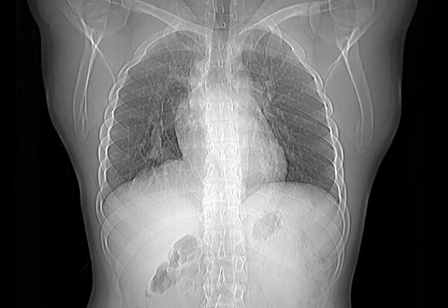Non-smoker, very healthy. Everything looks good. So, he was set for a chest X-ray. طبعا this is not the chest X-ray. This is a scout or survey of a CT scan. Let's take it as a chest X-ray. What do you see? Frontal chest X-ray of an adult male.